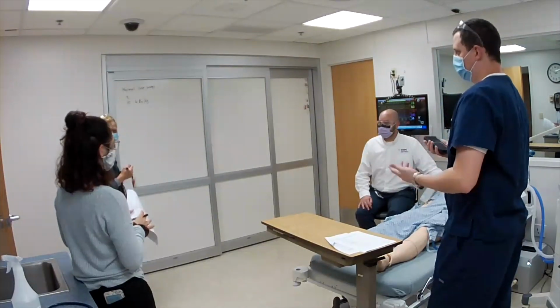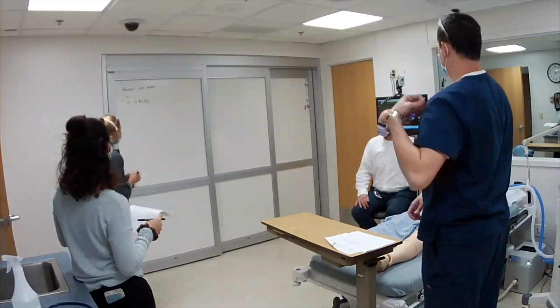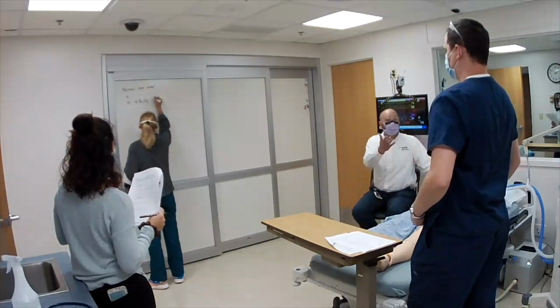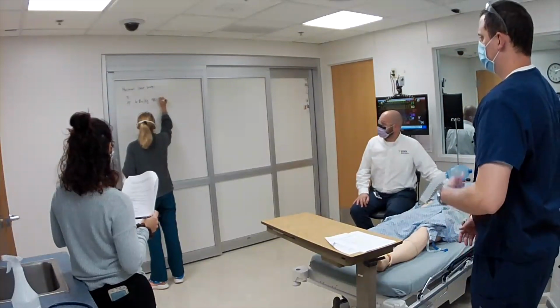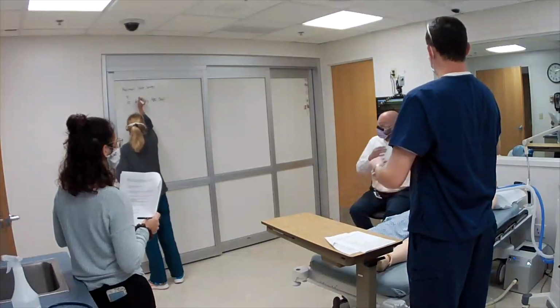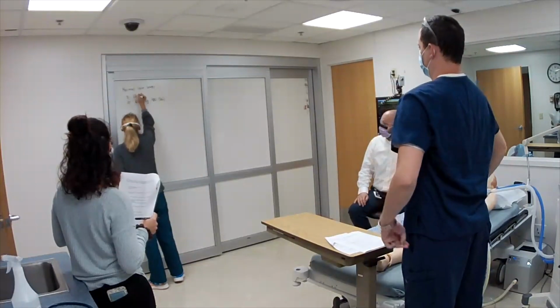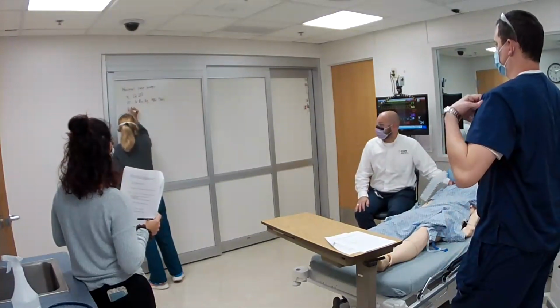And a rate, what would a normal rate be? 12 to 16. Yeah, 12 to 20, somewhere in there. Okay. What else do we need to know? We're going to put him on the vent. We need to pick an FiO2. And what else? PEEP. We need a PEEP, and depending on the mode, support. So we need a mode. We're going to have to pick a mode, right?